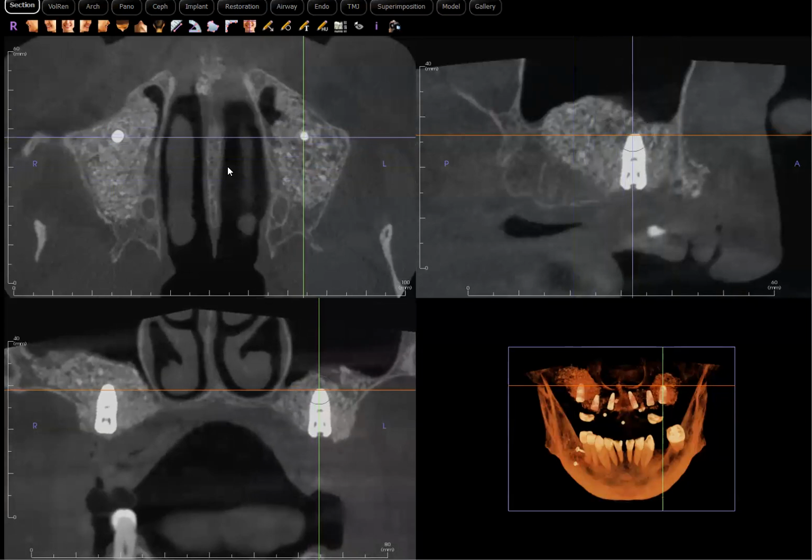That's very impressive. Let's see how long this implant is. It's measuring roughly 11 millimeters, but we have another 4 or 5 millimeters to go, basically. So I think if the provider wanted, they could have put in even longer implants.